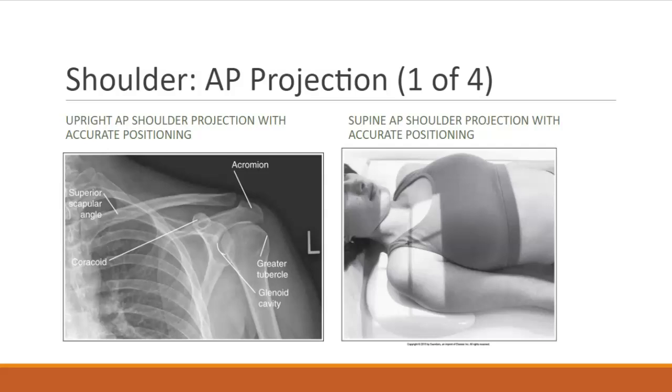In an internally rotated humerus, the lesser tubercle should be demonstrated in profile medially, and the humeral head should be superimposed by the greater tubercle. All projections should be marked appropriately with the correct word marker, such as externally rotated, neutral projection, or internally rotated.